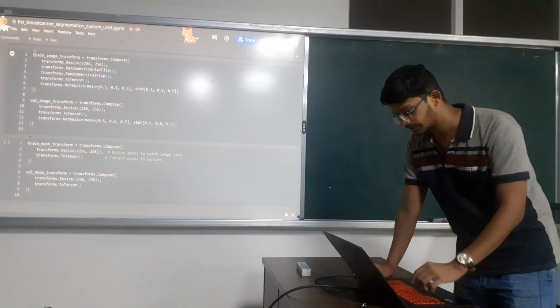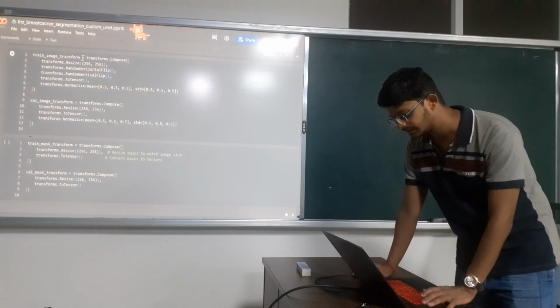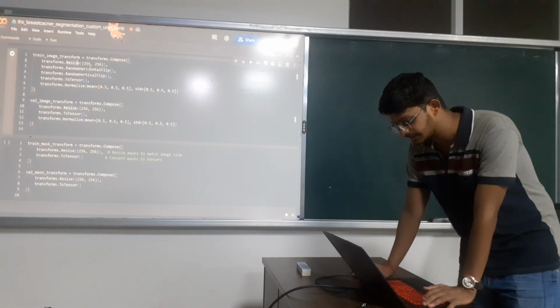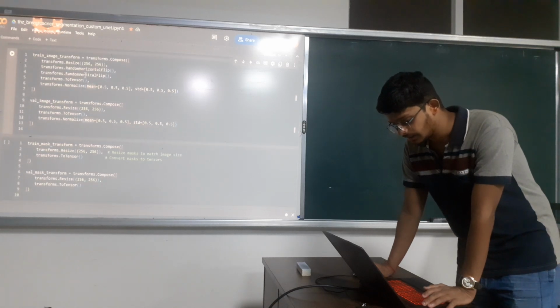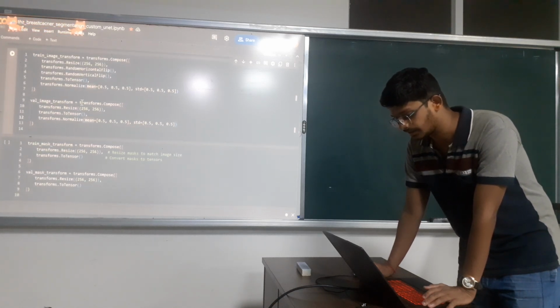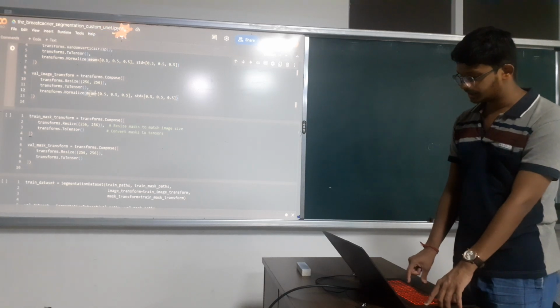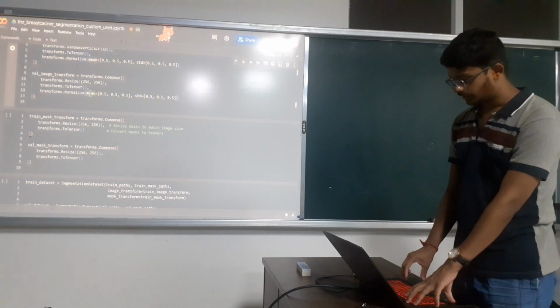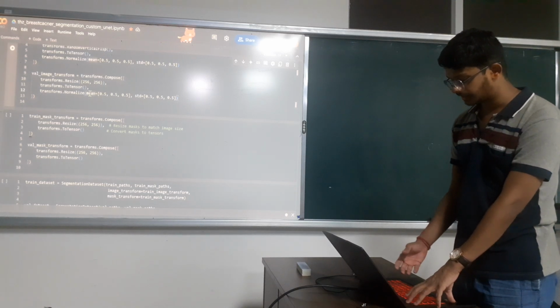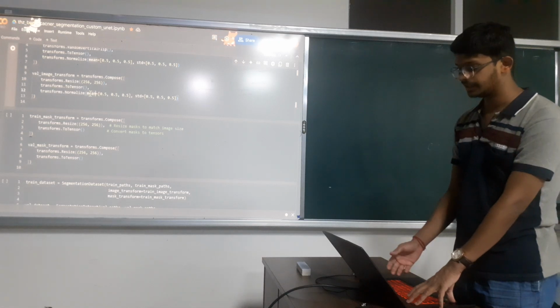After applying those train image transform functions, I am using compose, resize, horizontal flip, vertical flip, tensor, normalize, resize, all these functions with mean and standard deviation for the train image and validation image. These are not done for the test images, since the training and validation images are enough for telling the model how to perform the binary masking on the original image.